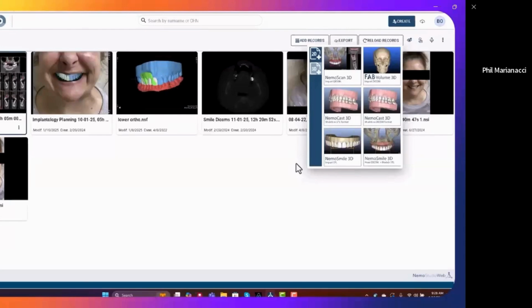First and foremost, any treatment plan begins or should begin with the face. This is well established in dentistry from both Frank Spear and facially driven treatment planning, as well as digital smile design, Christian Coachman and Florin Kofar. You'll see that we have two different offerings for a starting point for smile design. One is STLs only, the other is STLs and DICOM. Interesting things within restorative dentistry is to incorporate tooth root position to determine feasibility of prep lines, and also to see if additional orthodontic optimization is helpful for either implant placement or to try to work with minimally invasive restorative dentistry.